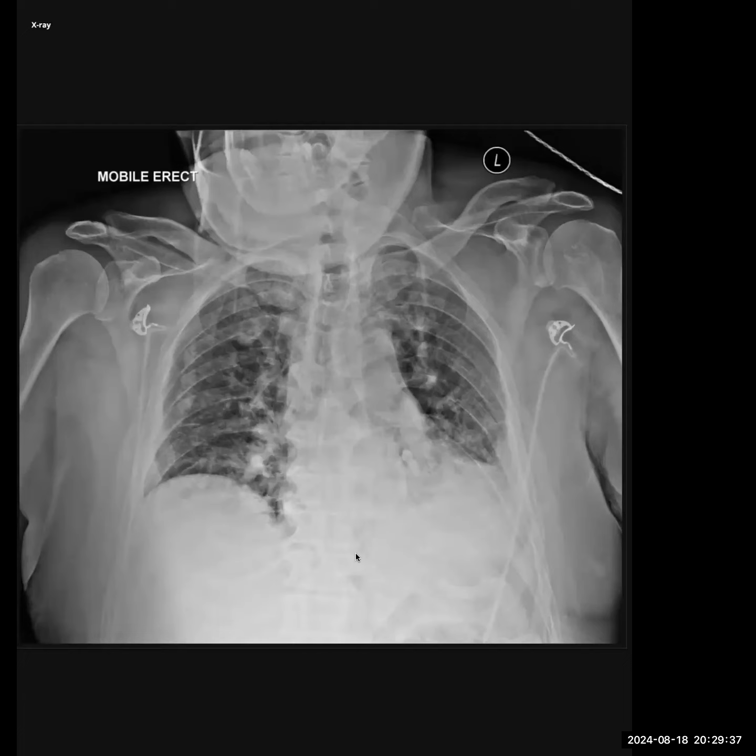Okay, I can see that there is a left lower lobe collapse evidenced by the sail sign and silhouetting of the left hemidiaphragm. If I trace the left lower lobe bronchus, I can see an opacity within it, which could be the reason for the collapse of the left lower lobe. This opacity seems to be a tooth. Since the patient has a history of trauma, I'm suspecting a foreign body aspiration of a tooth, which has led to a collapse of the lung.